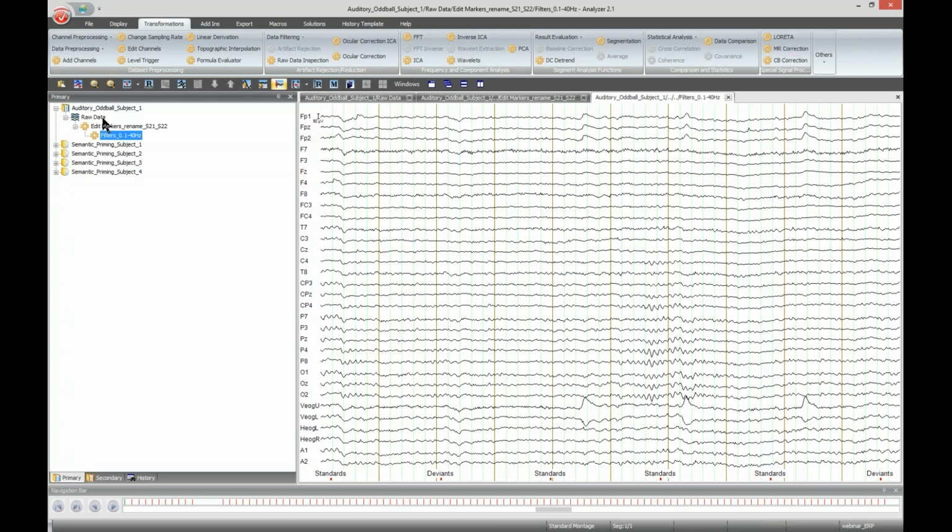What is next? I told you earlier that the data was recorded with an FCZ online reference. Depending on the effects you aim to analyze, the reference is an important choice. If you choose a reference close to where you expect the effect, you may not get any clear results, as the reference voltage is subtracted from all other channels.